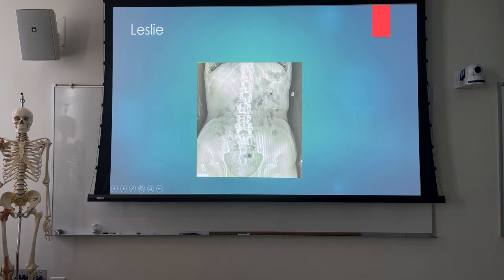What? They made me repeat it. They made you repeat it because of that right there? Yeah, they ended up doing a blind shot. Yeah, well, you know, that's something I think we've gotten away from. Back in the day, if you didn't put your marker on the image, you were going back and repeating the image. All right, so that might have been a little excessive. Might.